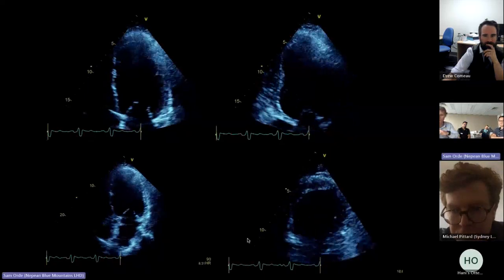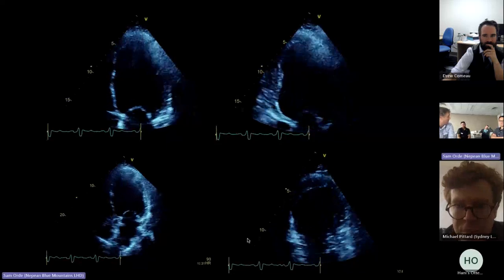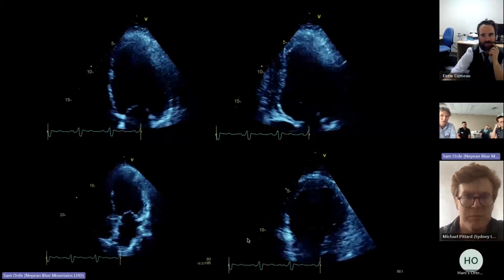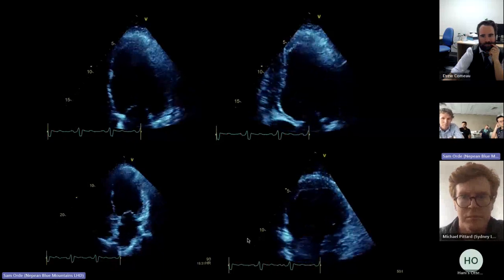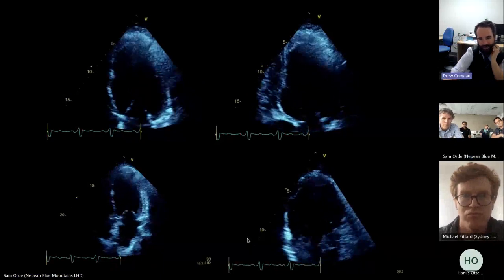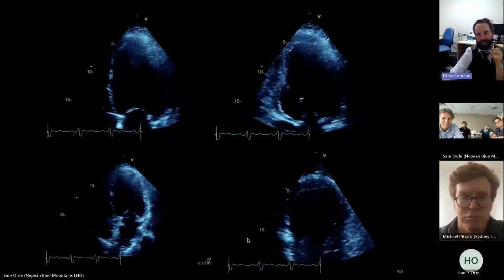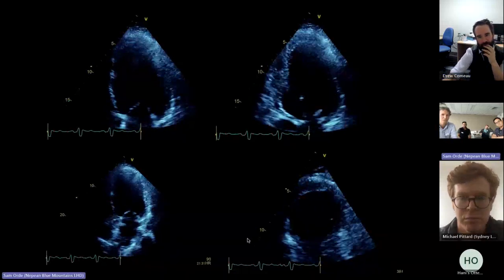Anyone confident to make a call? Online or otherwise? I wouldn't exclude thrombus, no, but just no way. Exactly. You can't exclude it. Yes, sorry, was it someone online? Look, I wouldn't be super confident, but I'm very suspicious. Yeah, great answer. And I think that's right.